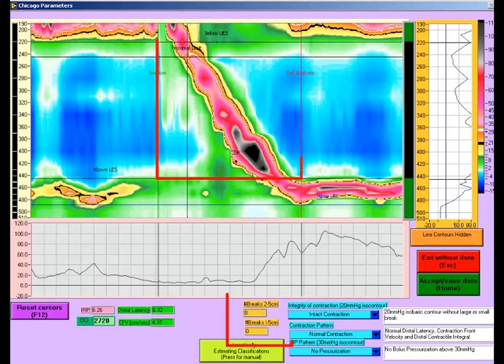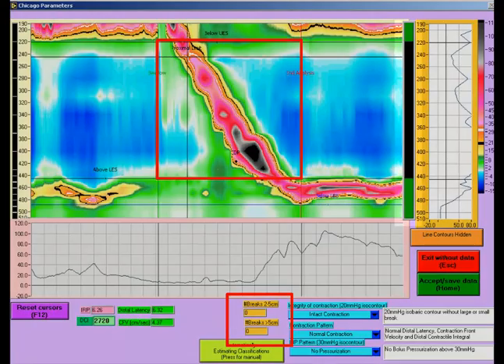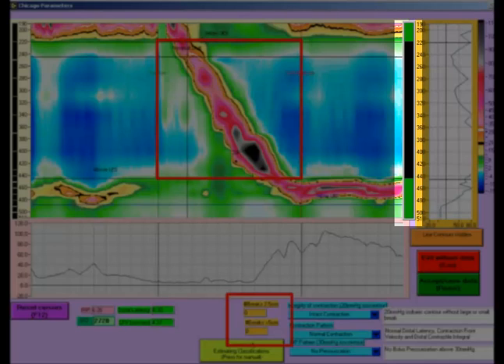Large and small breaks will be calculated from the maximal amplitudes between the vertical swallow and end analysis cursors in the x-axis and between the below UES and above LES cursors in the y-axis. Breaks will be indicated in the bar immediately to the right of the pressure topography graph as red areas. Black areas are intact contraction and green areas are outside the area of analysis.